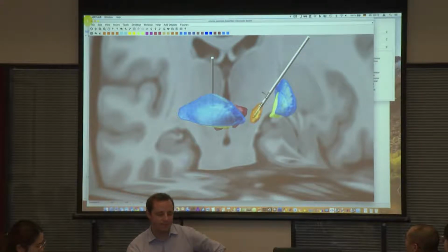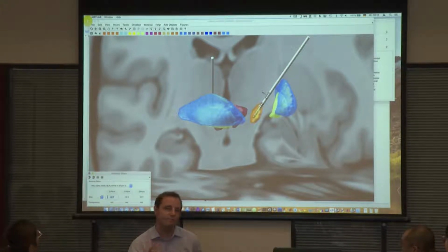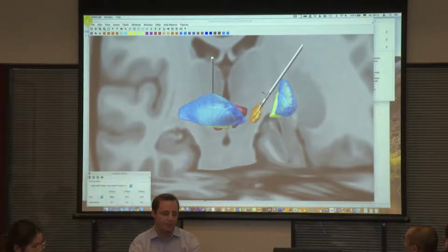And there's also this second small window down here, anatomy slices. And here we can also put in coordinates. For example, if we want to set the x-plane to 0, which is the mid-sagittal plane, we just enter 0 and hit enter, and then it's in the middle, right? So that's another option. And what we can also do is just hide them, right?